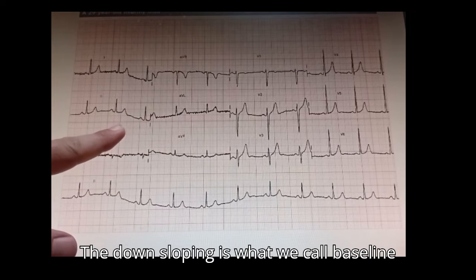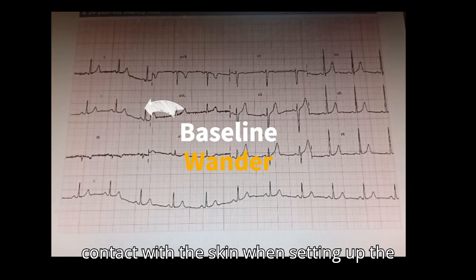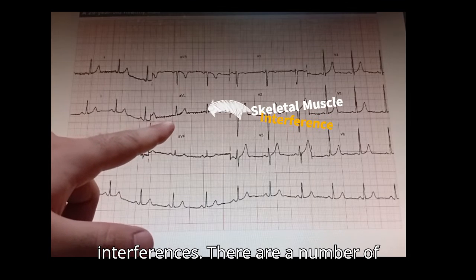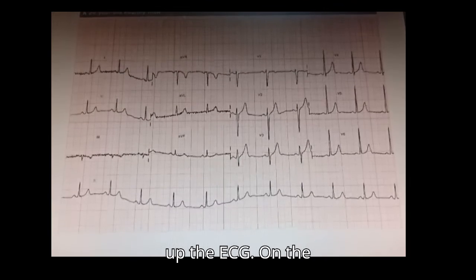The downsloping is what we call baseline wander, and it is due to poor electrode contact with the skin when setting up the ECG. On the other hand, these jagged lines are due to skeletal muscle interferences. There are a number of other issues that can happen when setting up the ECG.